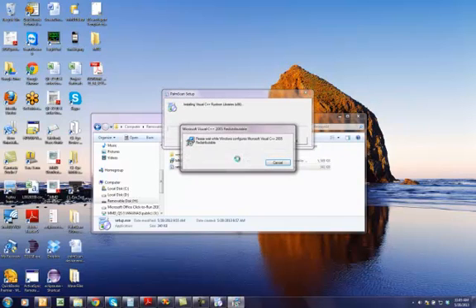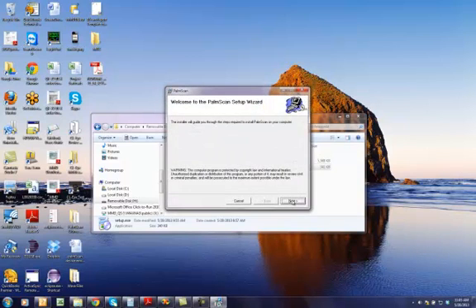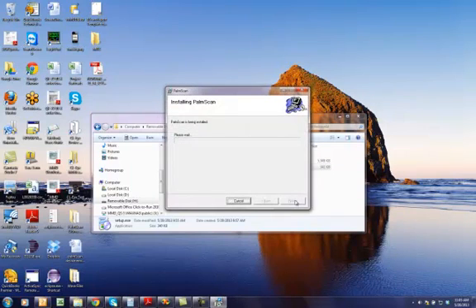The installer will go through and see what files need to be installed on your system. It will ask you a few questions on where you want to drive it. I think the default values are probably the best to leave. And once the installation is done, next you want to launch the application and then plug in the USB probe.